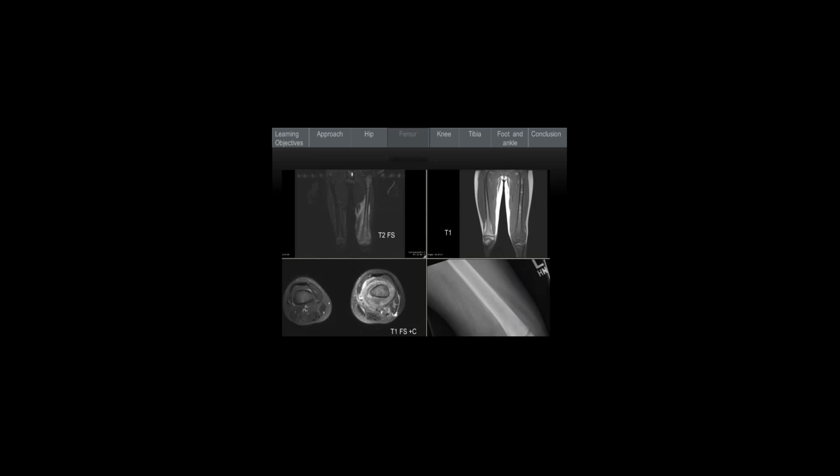As we did more workup of this 7-year-old girl, we did an MRI, and we could see that there was a soft tissue mass in and around her distal left femur. You could see it was replacing the normal bright signal of her marrow on the left femur, and there was quite a bit of edema in the adjacent soft tissues. The only sign on the x-ray was this periosteal elevation. This was osteosarcoma.